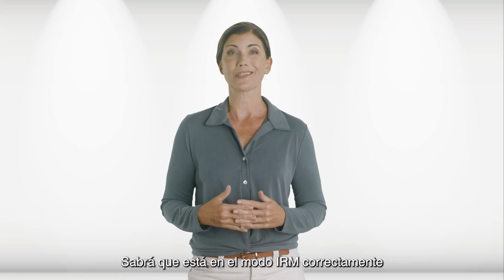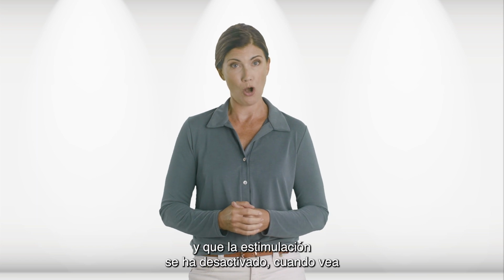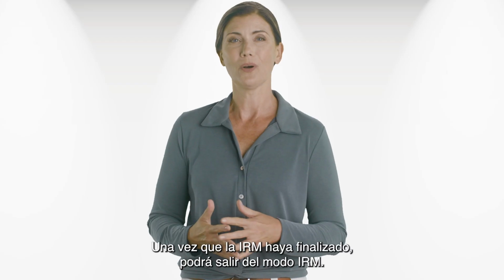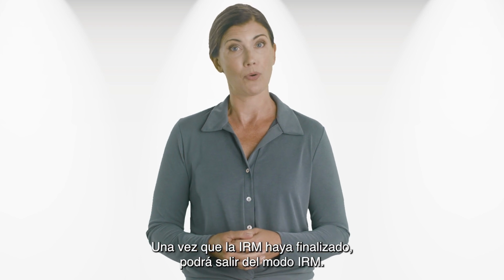You will know you're successfully in MRI mode and your stimulation has been turned off when you see your stimulator is in MRI mode on your screen. Once your MRI is complete, you will be able to exit MRI mode.